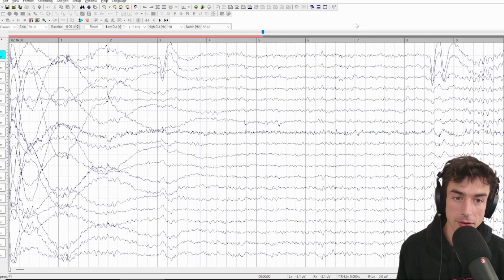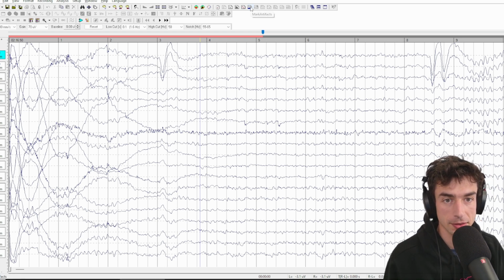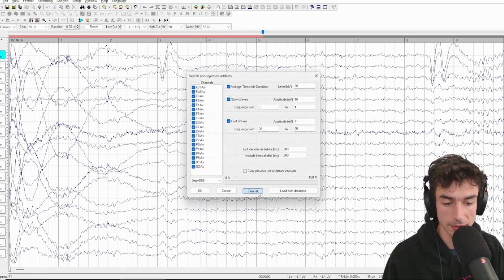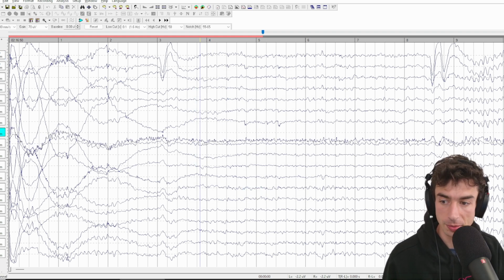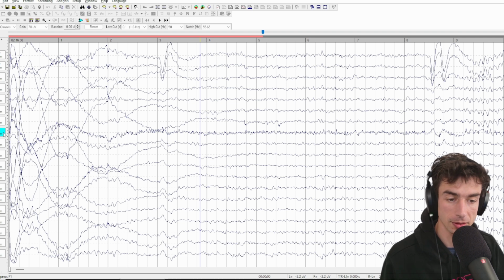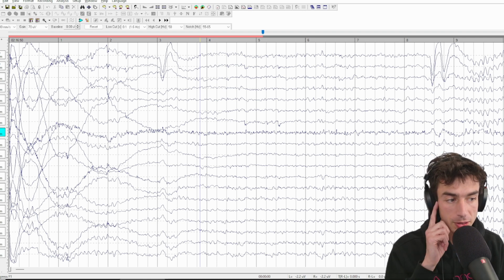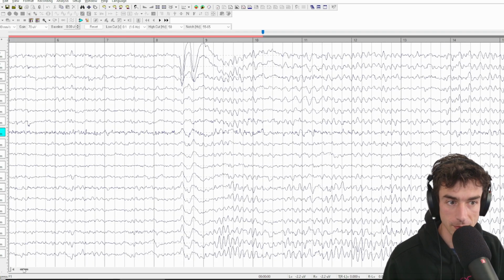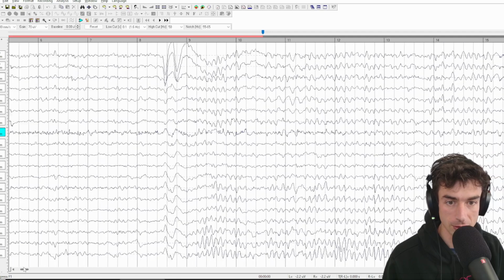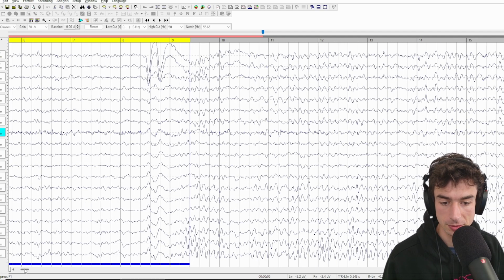Okay, and now let's take a look at the eyes closed data. I've removed all of the artifact rejection so that we can do it together here. And again, we see some EMG, this time actually more pronounced in the left midtemporal site, coming from the left jaw muscle. And some eye blink at the beginning of this, so we're going to assume that the person did not really close their eyes until about here. So I'm going to remove that from the spectral analysis.